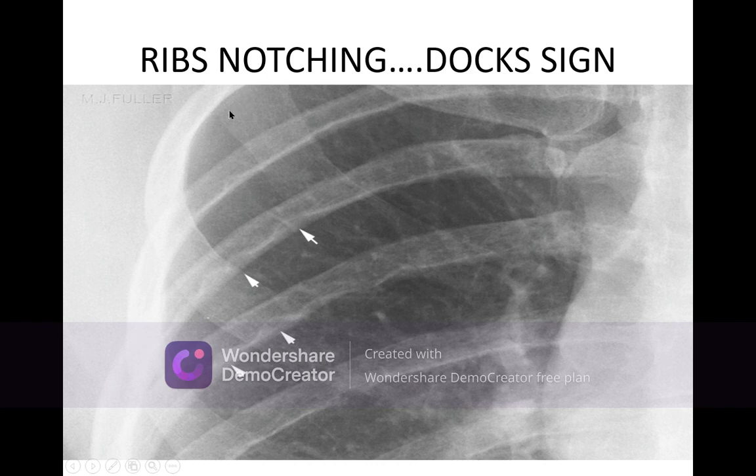One, the cardiological finding, as you see in coarctation of aorta. Also in venous malformation of the intercostal veins, because the intercostal vessels run in the lower border: arteries, veins, lymphatics and nerves. Because of the coarctation of aorta, the anastomosis is widespread, and that is why the arterial side is dilated and tortuous. It is serration. Venous malformations can cause this, no doubt about it.